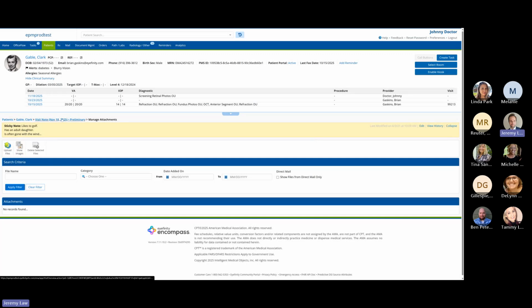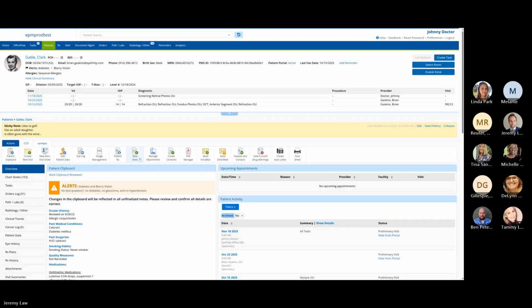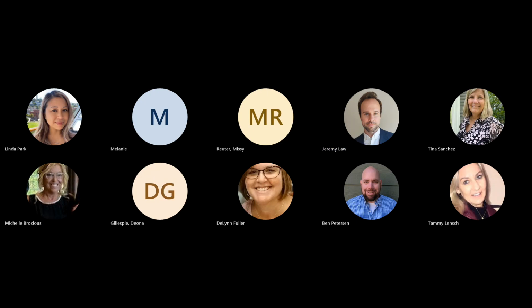Okay, and here is, well, this is actually one that I did earlier. Give me one second here. Apologies, just working in my test environment here. Sometimes it throws me some surprises. We'll go back and bring this back up.